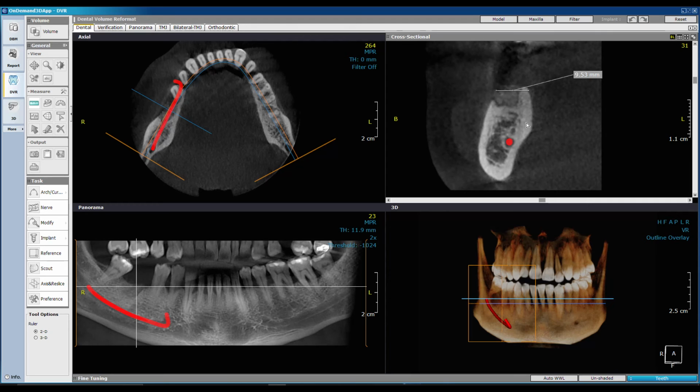To measure the second dimension, which is the vertical height of the ridge, I start from the inferior alveolar canal border, and then reach the first line that I already drew. So here we have the length is 13.82 millimeters. So this means that I can use an implant of a very wide platform, and the maximum length I can use for the implant is 11 millimeter in order to leave 2 millimeter safety margin from the inferior alveolar canal, because in cases of any nerves we should leave 2 millimeter as a safety margin.